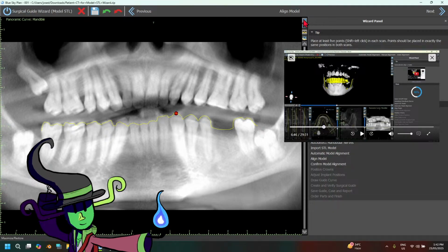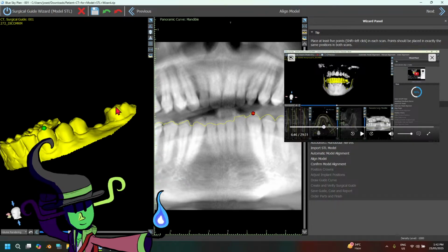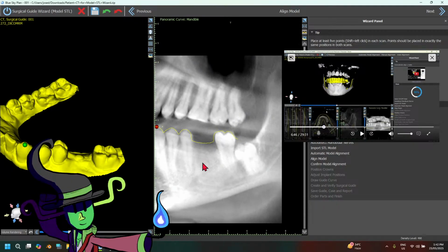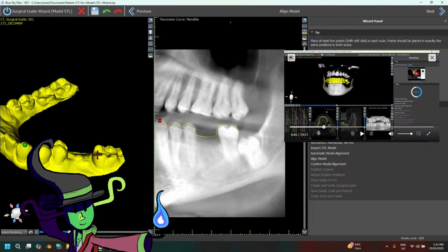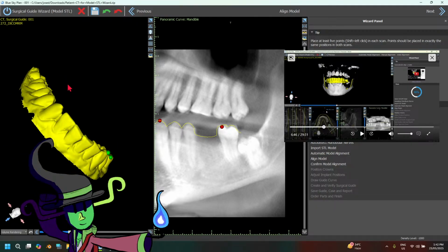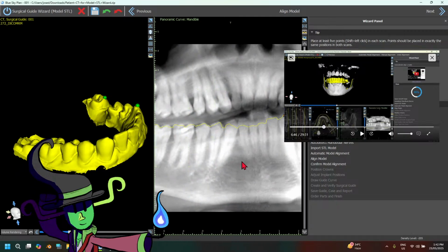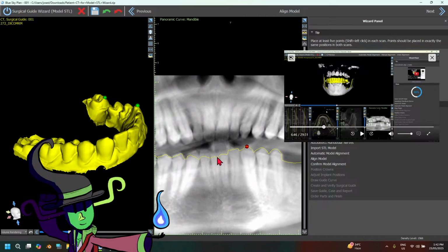And let's also place one over. Wait, let me just move this here. Okay. Middle left click to move this around, I guess. Over here. Oh wow, he has an impacted third molar here. This gotta hurt. Okay. Move around over here. We'll place this. Actually, can I?